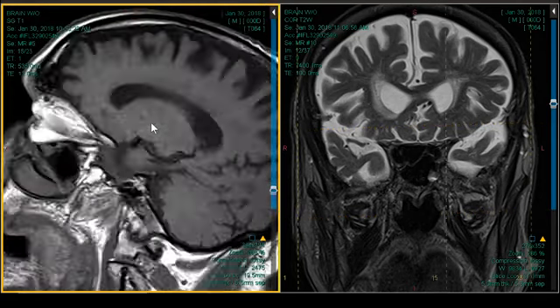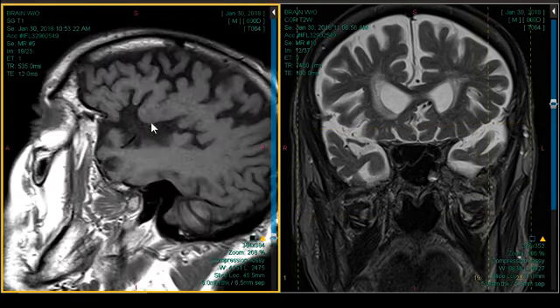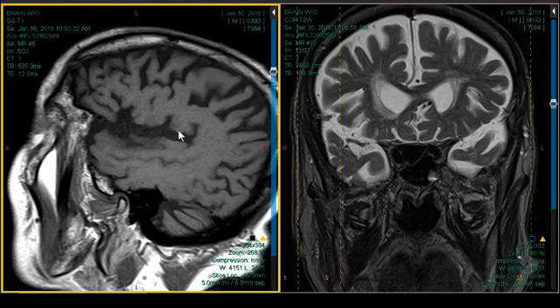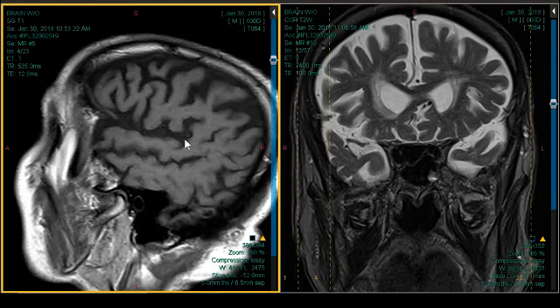Before we go to the coronal, let's go to the sagittal and look at the temporal lobe. Now, the temporal lobe, it's not a knife blade pattern of atrophy. It's on both sides. It's frontal operculum, it's temporal operculum, and it doesn't just stop. It kind of fades away. Let's look at the other side. Doesn't have that abrupt cutoff. This one goes all the way back, right? That doesn't happen in Pick's disease. In Pick's disease, the hippocampus is spared. The posterior half to third of the superior temporal lobe is spared. Not spared here. So that's a problem.